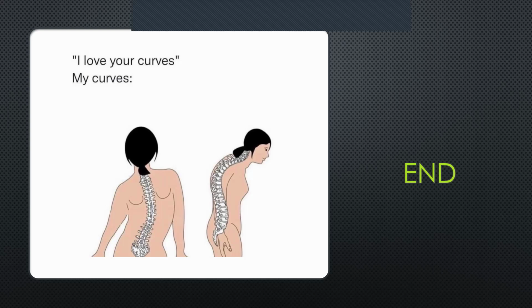Unfortunately, open mouth C-spine X-rays are quite difficult for a lot of people, especially in trauma. My advice is that if you have a patient with a severe injury or suspected C-spine injury, an open mouth view is one of your first-line investigations. Until you have those investigations done, do not send your patient out without any sort of immobilization of their neck. Make sure that you get it done. And if you have access to a CT scan and a radiologist, of course, much better.